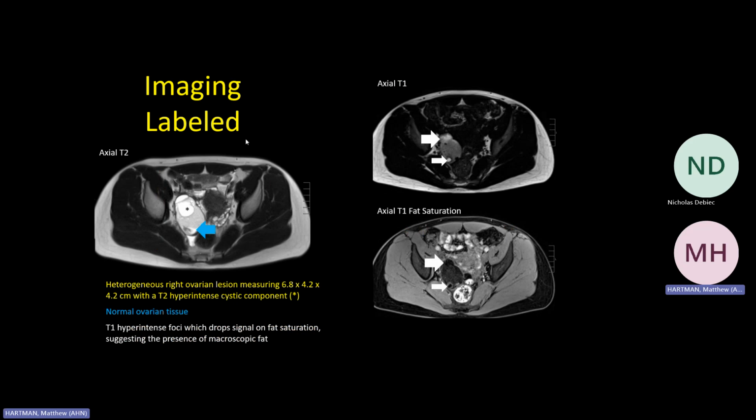So hopefully you saw the crash course pelvic MRI. Use this as a stepping stone. So identify this as a T2. And then note the subcutaneous fat is dark here, bright there. This is a fat sat, instant liposuction. And we have some areas that are bright here in the teratoma, which when we give them the instant liposuction, become dark or hypointense. So I think it's easier to tell on the CT there's macroscopic fat, but on the MRI, we can definitely confirm there's macroscopic fat here, some cystic fluid component. You're not going to see the calcium that well on the MRI, but we have a strong suspicion this is going to be a teratoma.